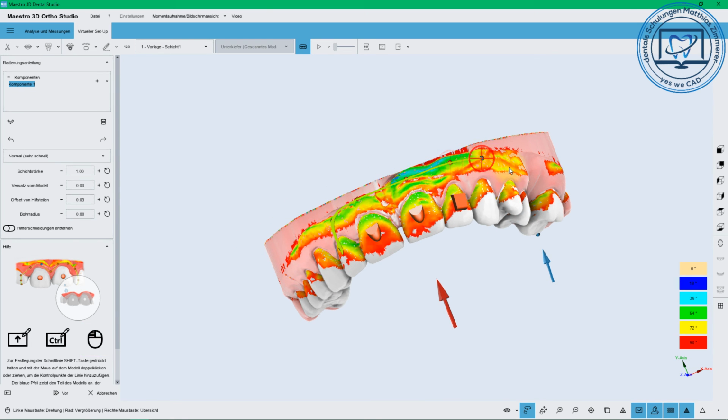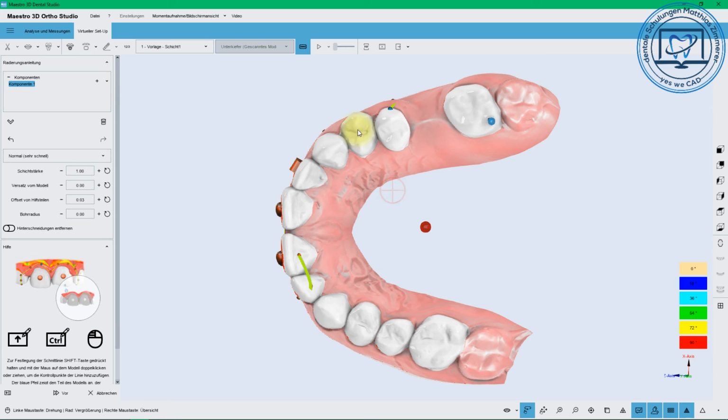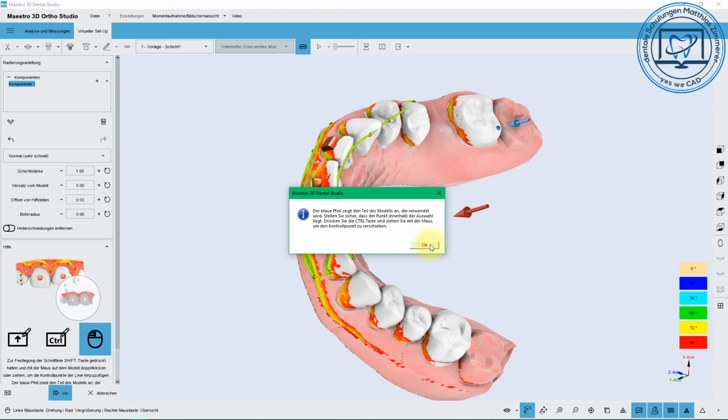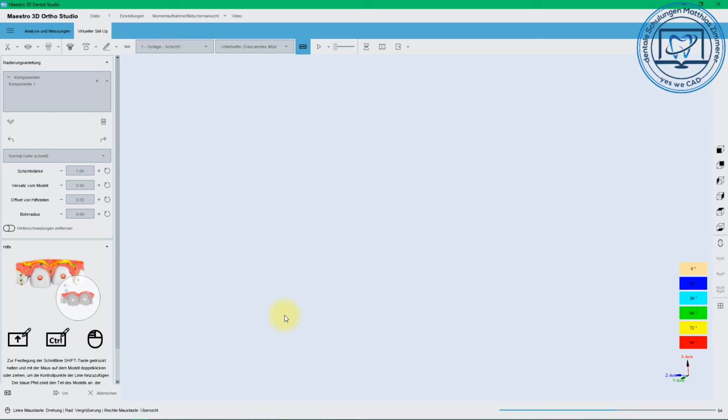You can set up the thickness, in this case 1 millimeter. The offset from the model would be the offset from the surface, and also from the attachments and the milling radius correction. But we are 3D printing, so you can set it to 0. So always beware that the blue arrow is in the etching guide in this case, so the software doesn't work if it's not in the area of the guide. And so you have the etching guide.